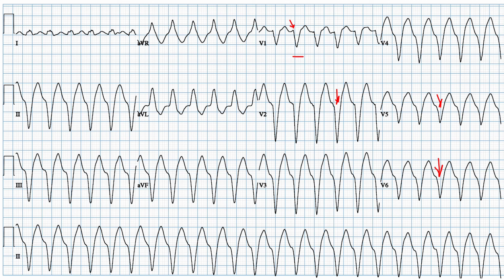VT. Now, just a note here: if there was no little R prime here, this would generally be called concordance. For those of you who know the Brugada criteria, the first step is asking whether there is concordance.